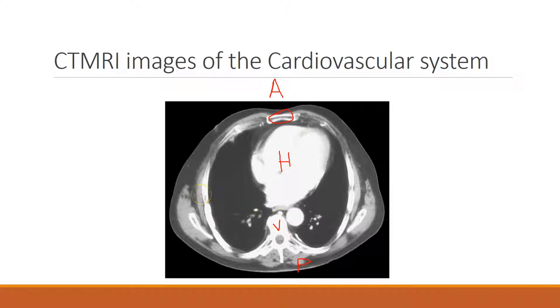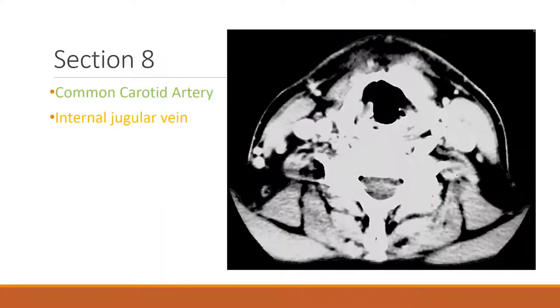And then you need to know if you're looking top down or feet up. And it does happen to be feet up. So you're sitting at the foot or feet of this person, and imagine you've got x-ray vision and you're looking up through their body in this CT scan. Now, why is that important? That's important because that means this side of the body is the right side, and this side of the body is the left. And that's consistent with any other frontal diagram you've looked at. We wouldn't want to mix up our right and left, especially if we're about to perform surgery or something like that. So now that you're oriented, let's go ahead and look at some cross-section images.